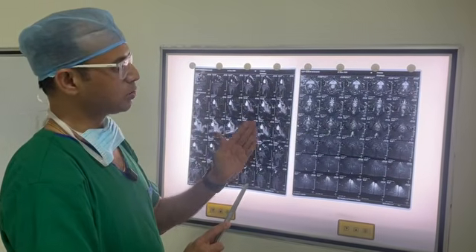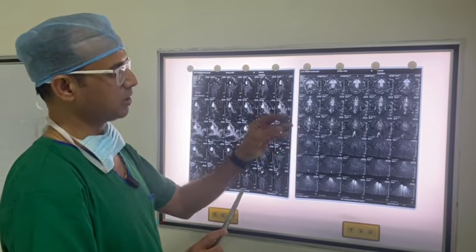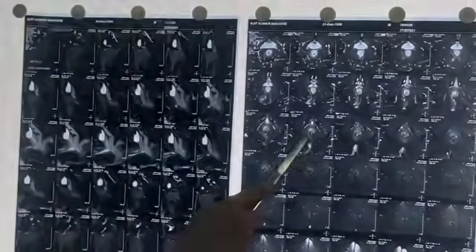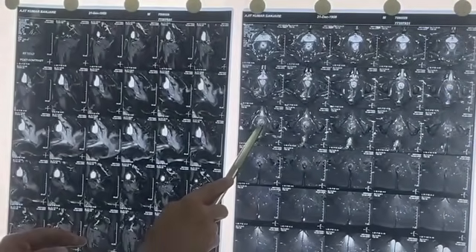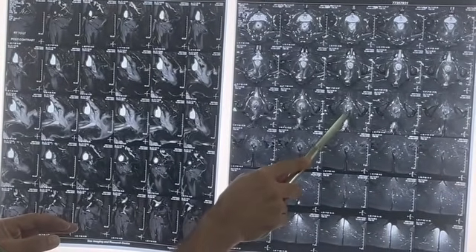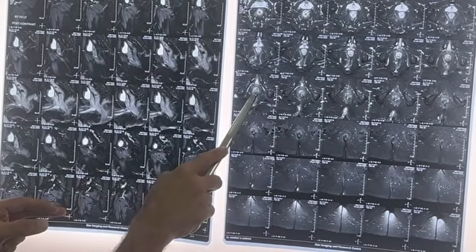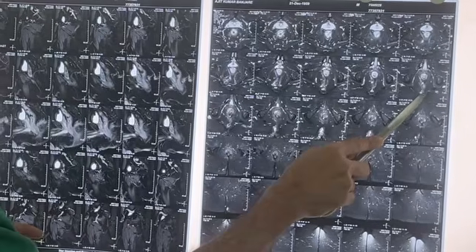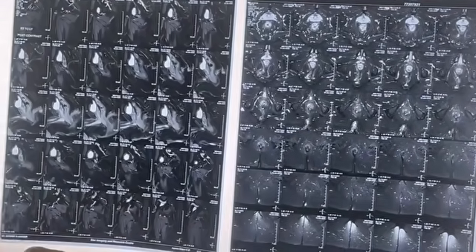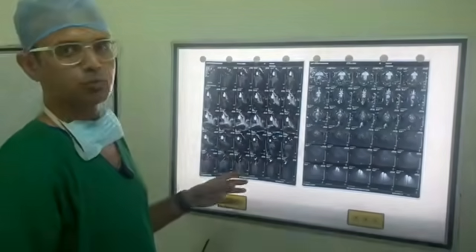One component is going just below, the posterior high transsphincteric, starting at the internal opening at 6 o'clock, going into a transsphincteric tract. This is a transsphincteric tract, a deep postanal tract, in the intersphincteric region. This is just an internal opening, meaning it is a tract. Internal opening at 6 o'clock, intersphincteric tract, transsphincteric tract, going into the deep postanal space, going paracoccygeal and reaching up to the tip of the coccyx, opening at 6 o'clock: a posterior high transsphincteric tract. So we may need to consider a sphincter preserving procedure for this patient.